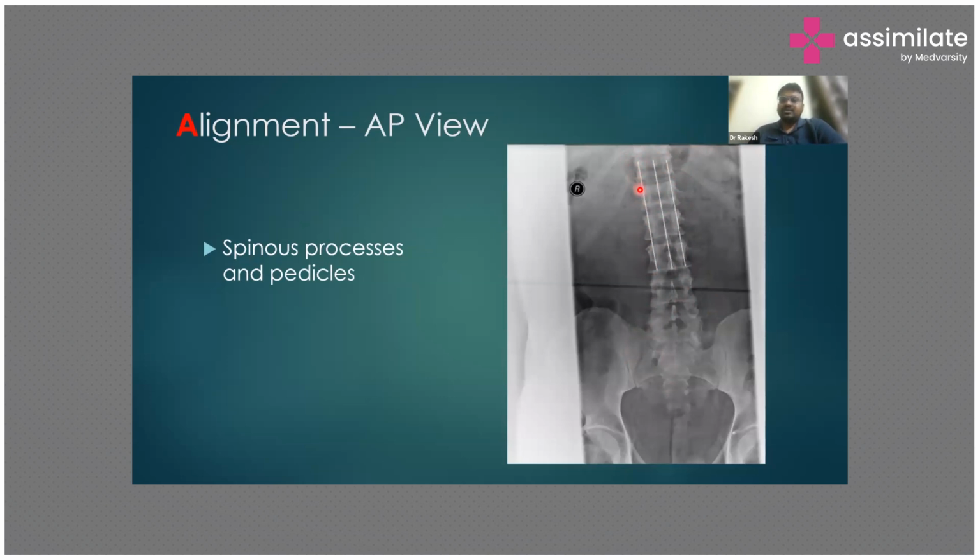So you can see this is fairly rectangular, and when you're going down the lumbar to the sacrum, your vertebral bodies widen. So naturally your pedicular lines laterally also will widen, but remember, it should be a smooth lateral curve, and the spinous process line should be fairly straight.